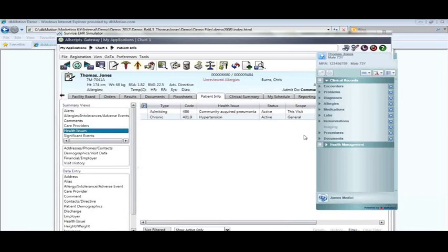A couple things here, and I'm going to go into the clinical views in more detail, but the semantic vocabulary management piece of this is key. You don't want this thing flashing because I have an allergy to Bactrim in my chart and someone else has an allergy to Septra somewhere else out in the community.